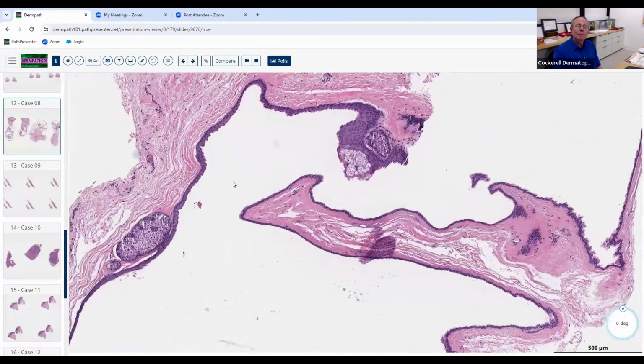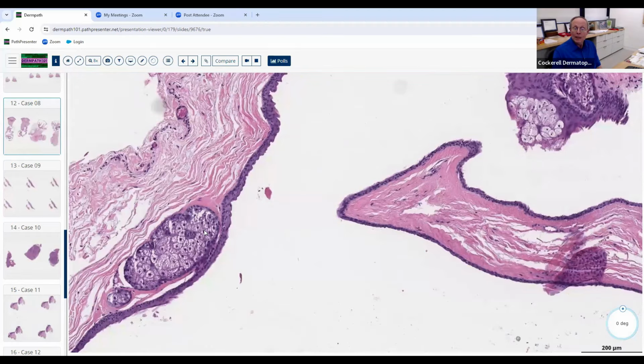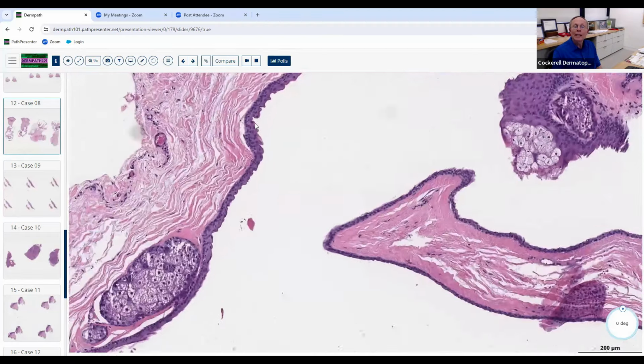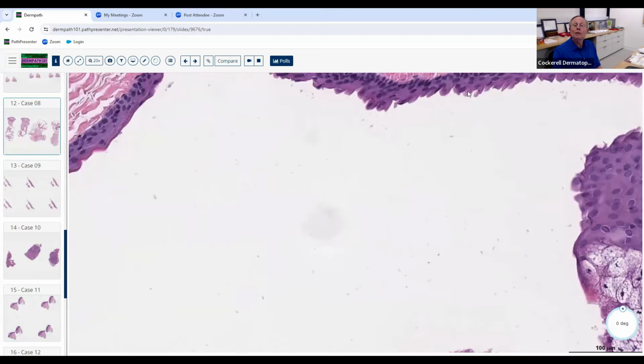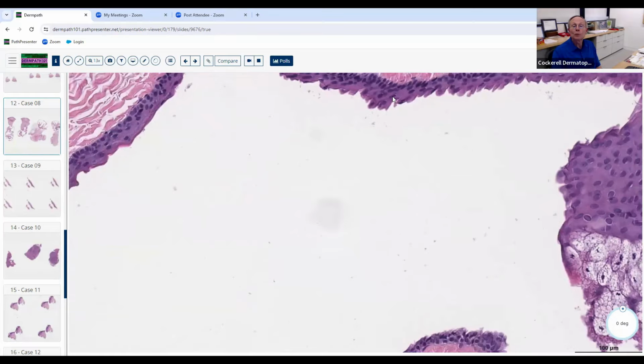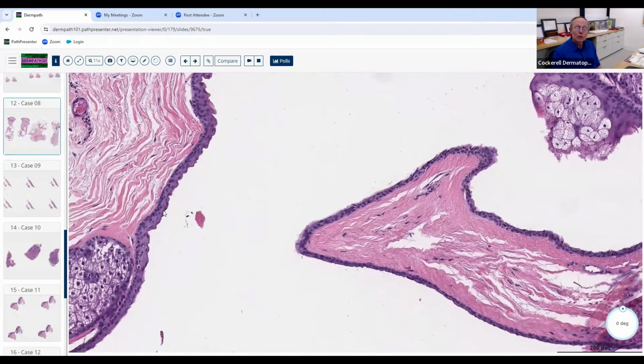Is it lined by epithelium that's got sebaceous lobules in the wall? And notice the corrugated lining here. It's thrown into folds. This might actually be a tiny bit of apocrine epithelium here. And that shouldn't necessarily surprise you, because in the embryo, the sebaceous gland and the apocrine gland come off that mantle zone area where the stem cells are.